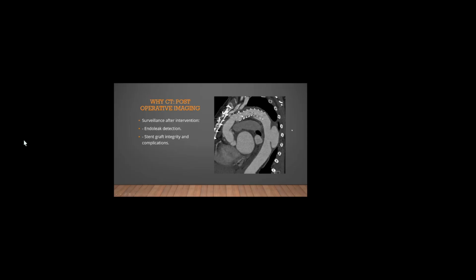After receiving the proper management, sometimes CT could detect any complication. For example, this patient had a stent, an aortic root, and ascending thoracic aorta replacement. We could see here those are the points of the anastomosis of the new aorta. So we could provide insights about complications like endoleaks around those stents, and the patency of those stents. Is there any leak around the anastomosis? Are there any kinks, or any complications? For example, there is a big ulcer in this case coming out from the descending thoracic aorta. And thank you very much, if there are any questions.